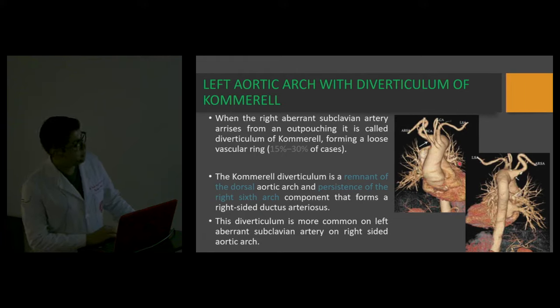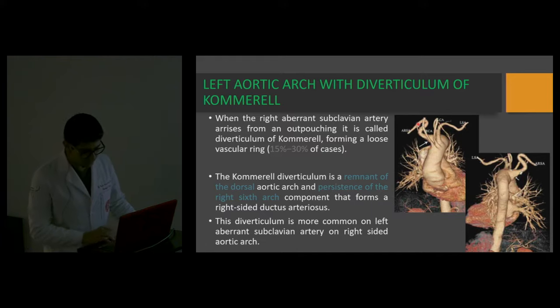This volume rendering shows an aberrant right subclavian artery with the diverticulum of Kommerell from the right subclavian artery.